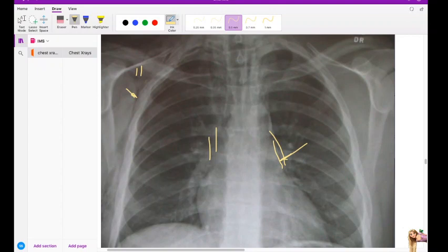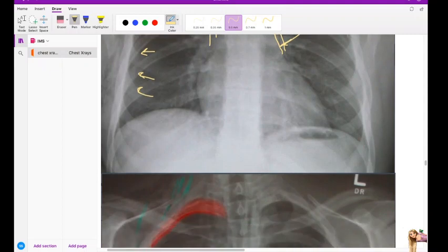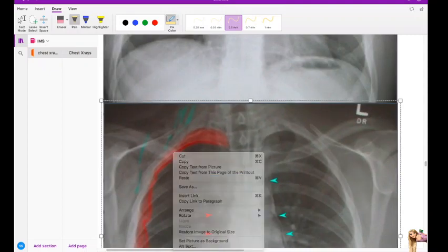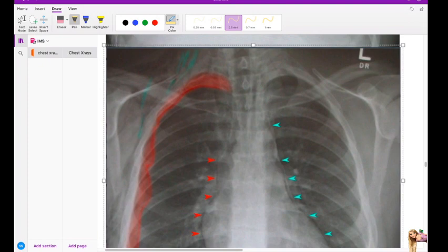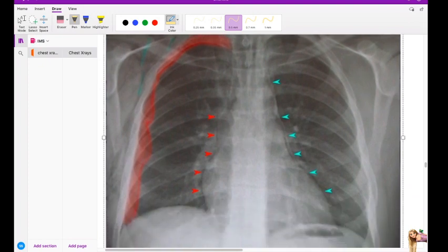And then if you look at this very subtle area over here, there is a visceral line, which is kind of indicating a pneumothorax. I think it's difficult because I'm streaming, but if you guys see the images for yourself, you'll be able to pick it better. So this is where it's showing marked: the pneumothorax, the emphysema, pneumomediastinum. Basically, the patient had a rib fracture because of the trauma.